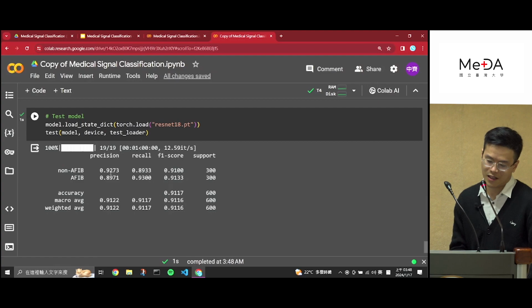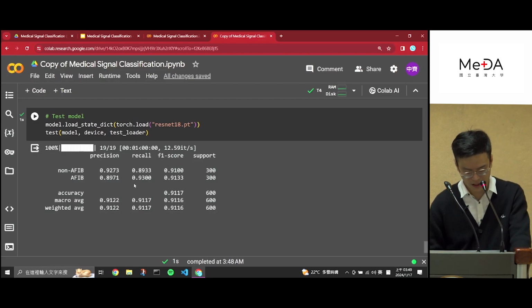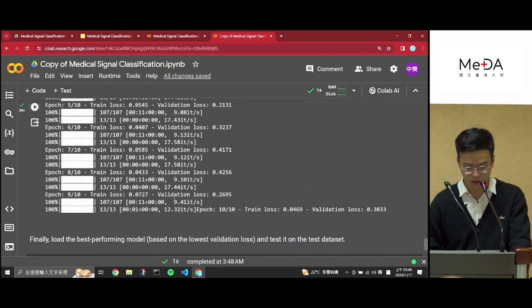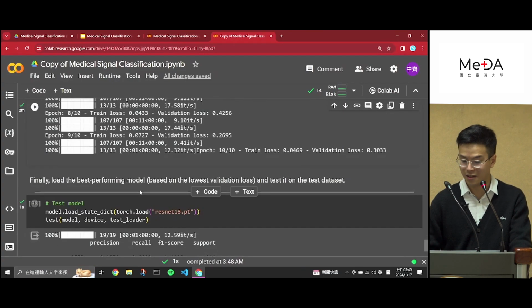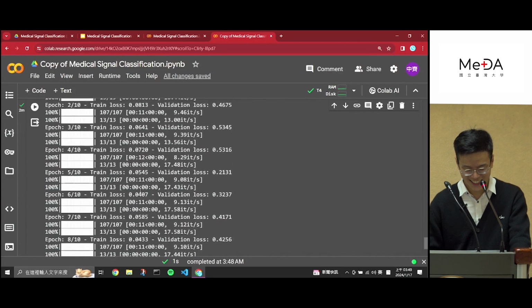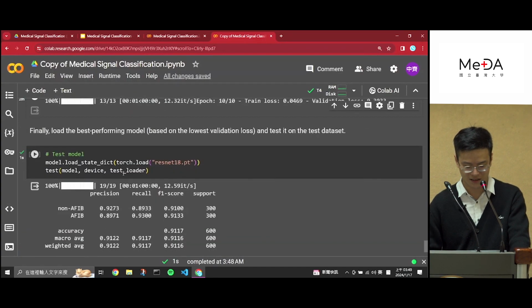So you can see that if we remove the transformations, the align center and the baseline removal and white noise removal, the performance has gone up, especially with the randomness added into it. The randomness was added to prevent overfitting. That shows as well, since we have the lowest validation loss happening at epoch 5 instead of epoch 2, which is a lot better intuitively. So that means that the model is not as prone to overfitting.